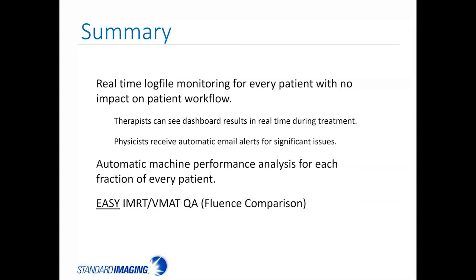The physicist can receive automatic email alerts for any significant issues based on how you've set up your parameters and your preferences in the software. And so you have automatic machine performance analysis for each fraction of every patient. And it's easy IMRT VMAT QA fluence comparisons.